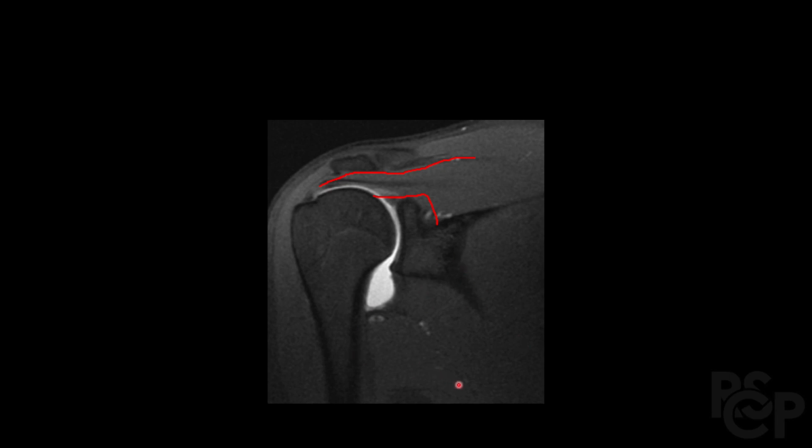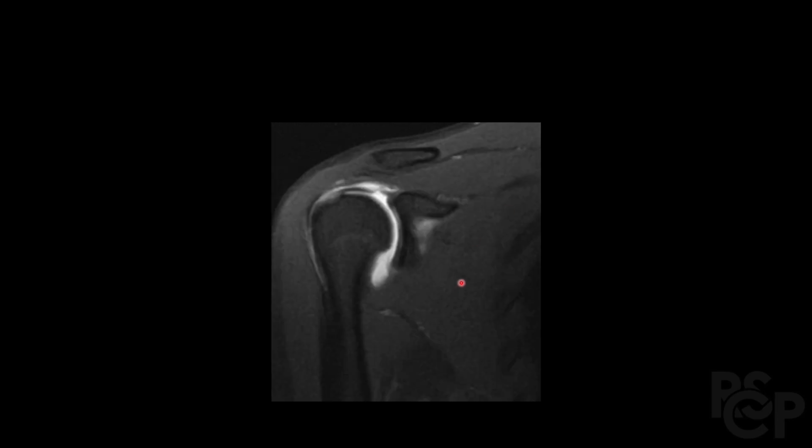One of the things to look for is a superior and inferior labrum. So the superior labrum is right over here, the small triangular area, and then down here is the inferior labrum. Okay, and now we're even a bit more anterior, so all of this is the subscapularis. It's becoming more prominent. Up here, the supraspinatus is still visible. We still see the clavicle up here.